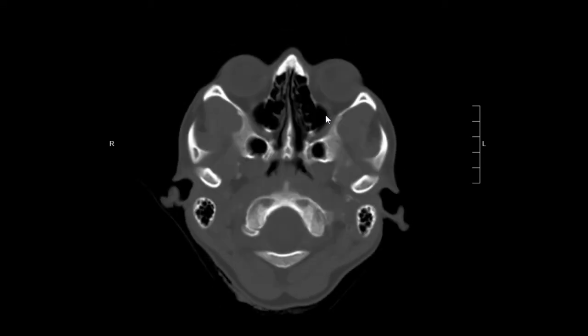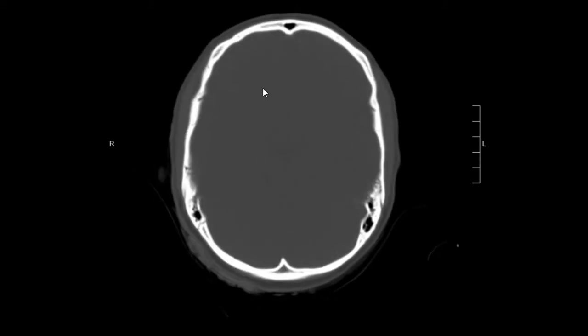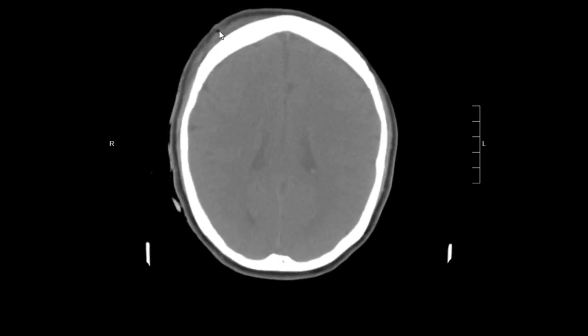So this is a CT of the head. The indication was trauma. There is no acute intracranial abnormality, but there is a small right frontal scalp laceration.